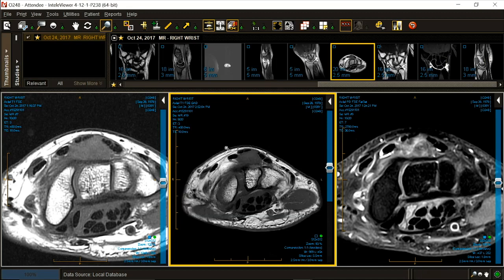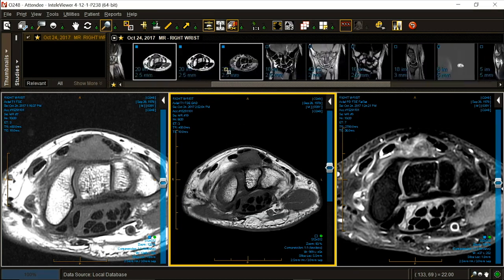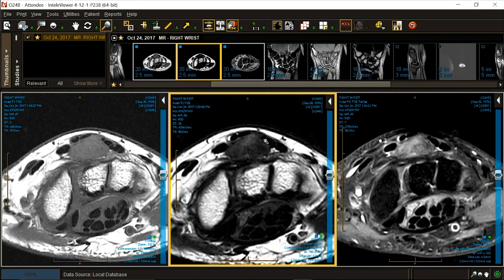So the signal intensity of our lesion, intermediate to low, agreed? Quite low on T2. So what is the differential diagnosis of low signal on T2? Before we do that, do you think it is aggressive or non-aggressive? First decision: boundary crossing, invasion. Yes or no? I vote no. Big, but not invasive.